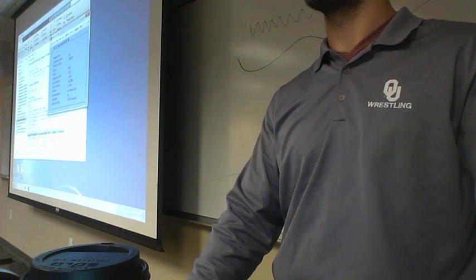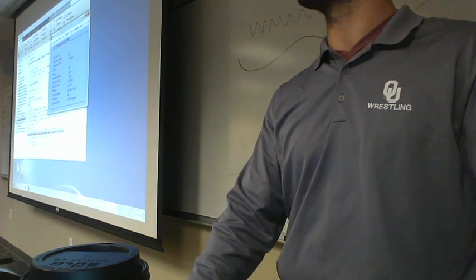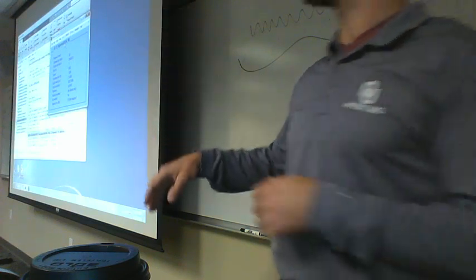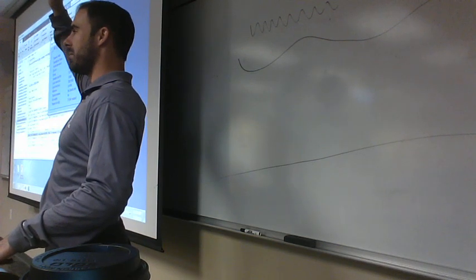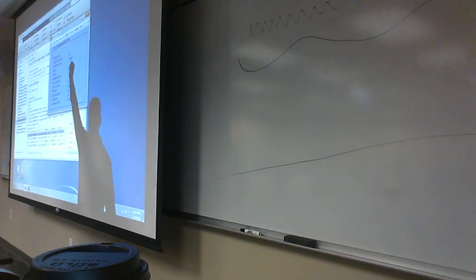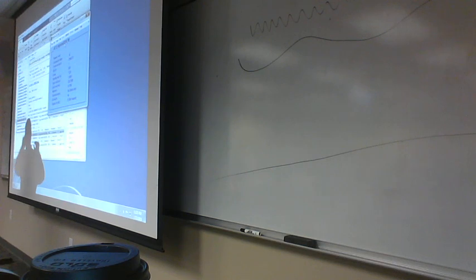Everybody paying attention? Okay. Now we have this, and remember when we plotted the data before, it looked all crazy because you only saw a couple traces? Well, why did we need to scale that big? Anybody have ideas? We went to like 500 on the scale, right? It was massive, because there was such massive drift. It's drifting across an hour-long recording. So even though it's a small little oscillation, they're going huge. You guys remember seeing that in our lines? Okay. Let's see if this changed it.